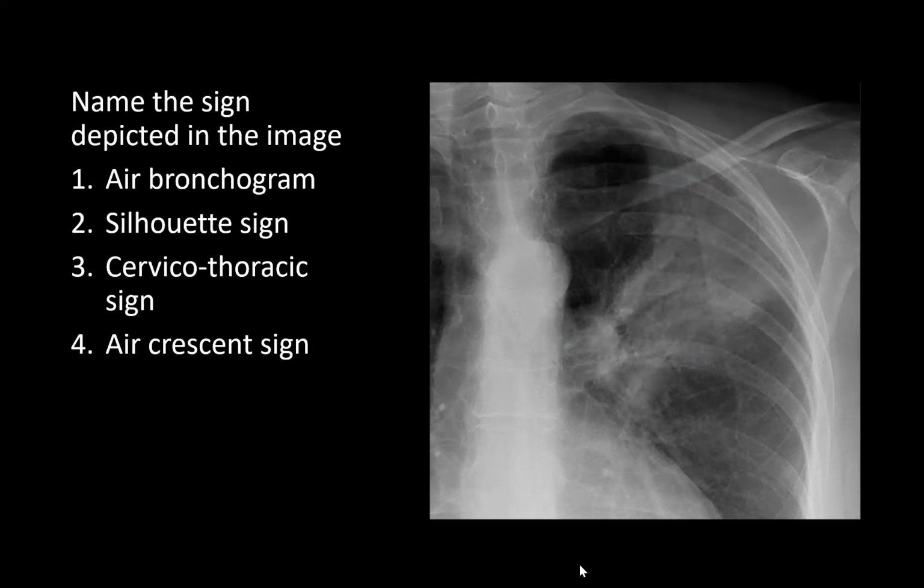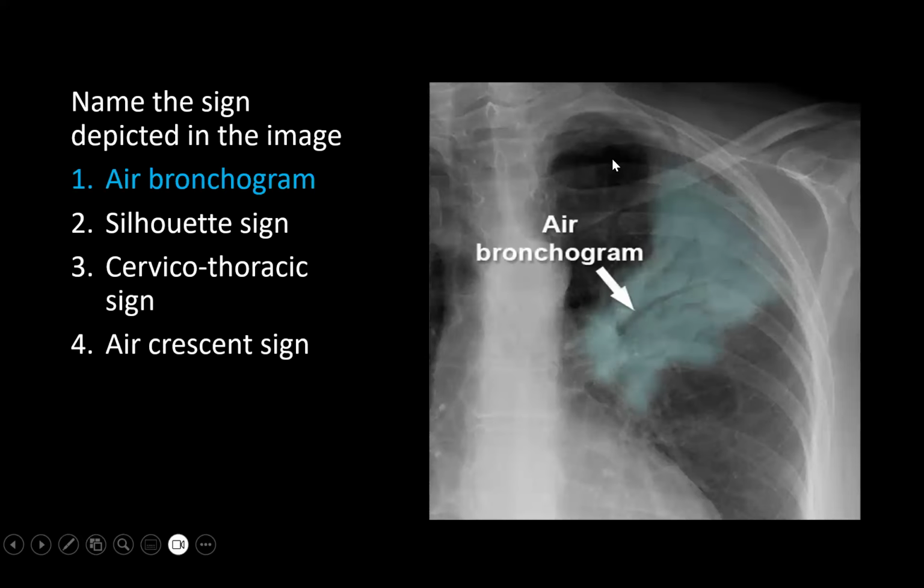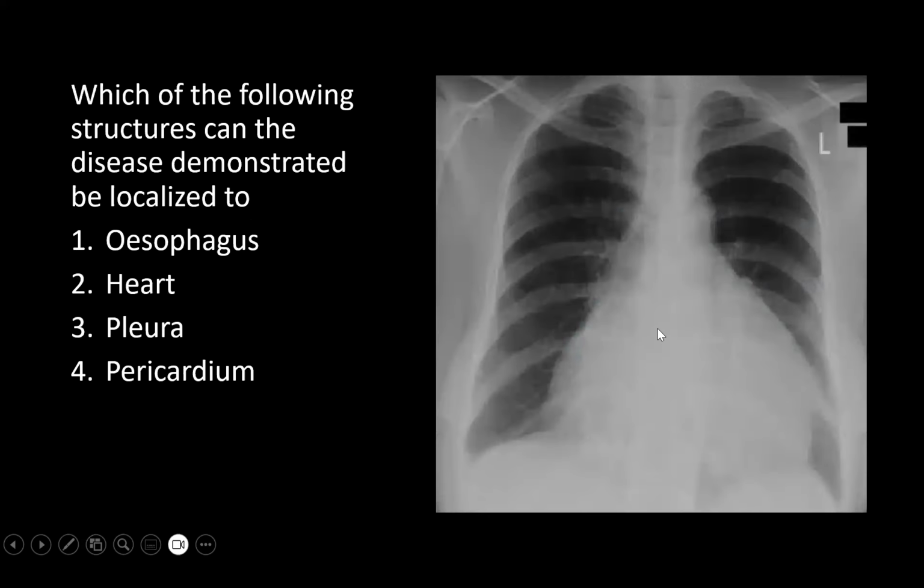You will notice that because of the opaque pathology or the opacity in the lung, the air that is left in the traversing airways, the segmental and subsegmental airways, gives this contrasted appearance of a dark branching linear structure within a whiter or a more opaque structure. So this becomes an air bronchogram. And if you get this history of fever, cough, if there is an effusion, this is because of a pneumonia. So there is residual air in the segmental airways.